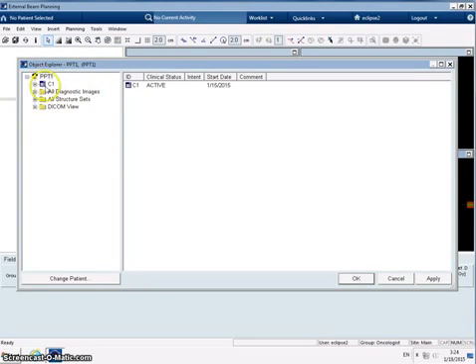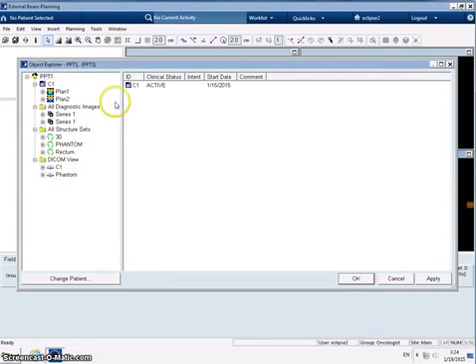So it uses file trees a lot, like older versions of Windows really. So this is the patient here, and we can expand and minimise these trees. And the screen can get quite busy actually with lots of things open, so as a general rule I tend to just display the things that I want to see. But let's have a see what they are.